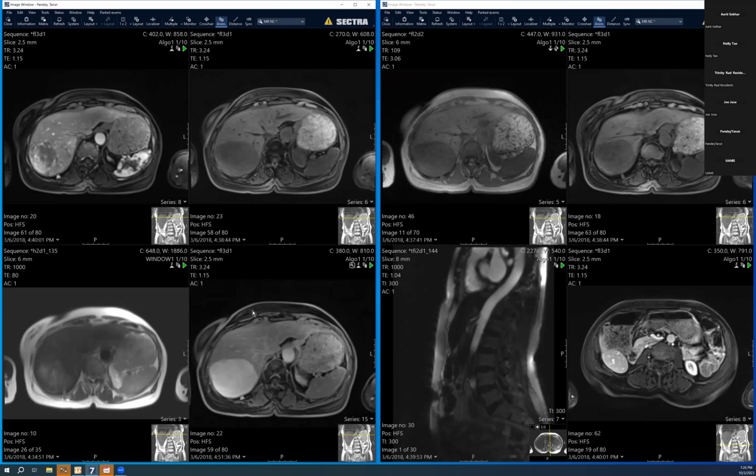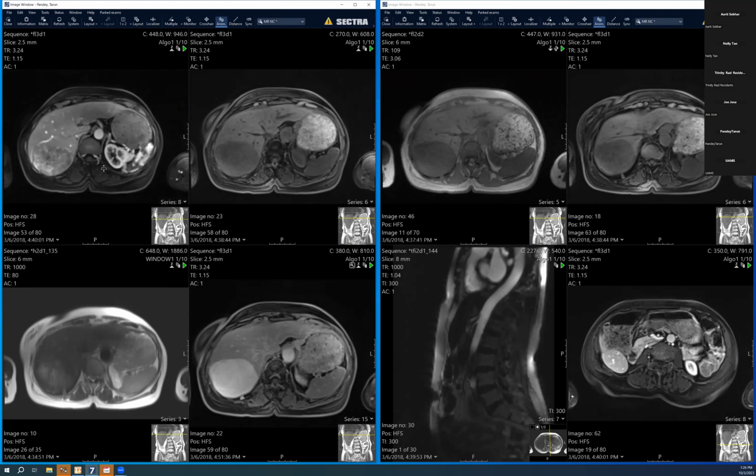Nelly, yours had those cystic spaces. This one's dark. I've had ones that are bright. I feel like they just do so many different things. But afterwards, now I'm not surprised. Yeah, there is no winning.